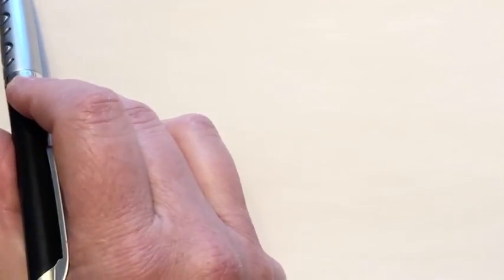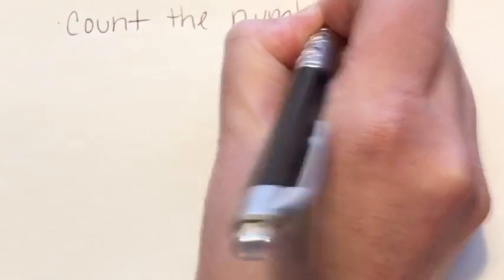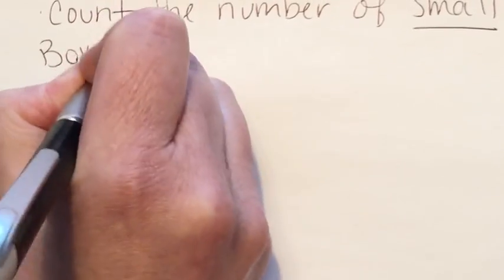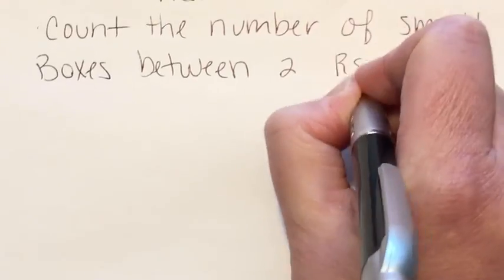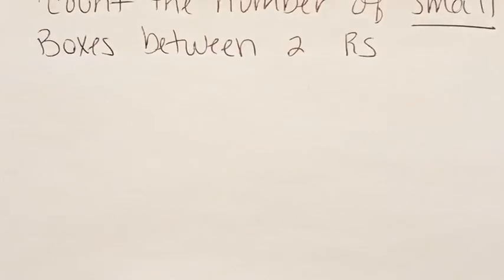I'm going to switch to this piece of paper here. So I put up here 1500 rule. It's used to measure the heart rate on an EKG. You will count the number of small boxes between two R's. So I said there's 19 boxes.